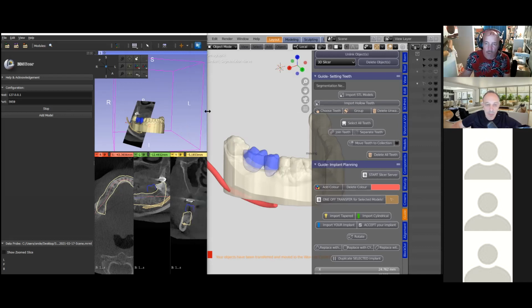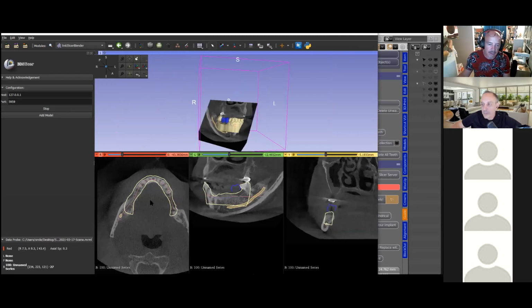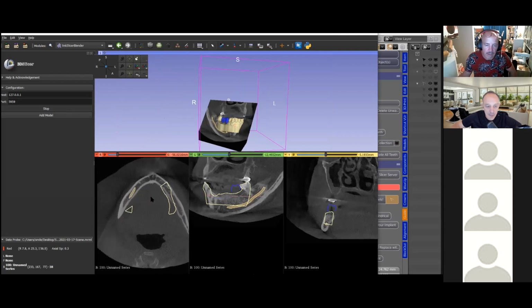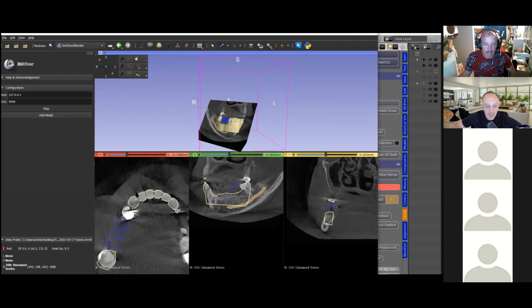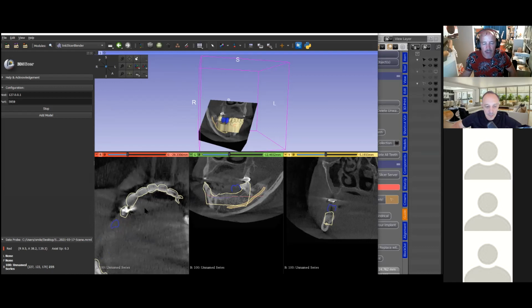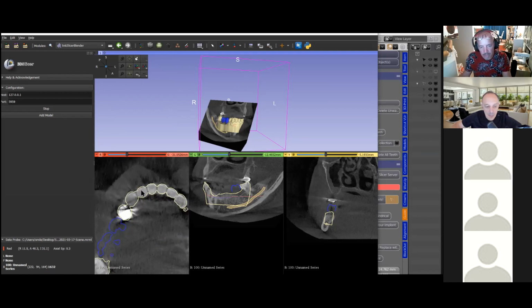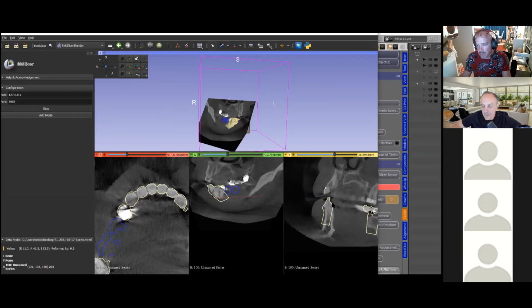All right, we're going to just quickly have a scan through and see whether this has been nicely aligned. Okay, so I'm going to roll my mouse wheel and have a quick look. A good way of telling is if the boundaries of the DICOM are nicely outlined. If I click on Shift and move the mouse, I'll be able to see the cross sections as well. So we've got a very good alignment here, I can tell. This is very critical to the success of your implant surgery.